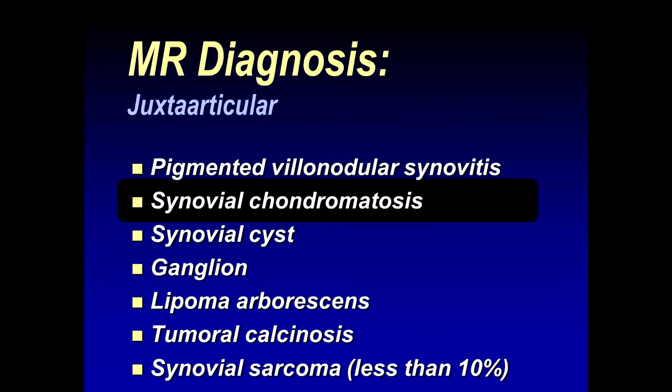And finally, there are a few associated findings such as edema that we can see very nicely, or inflammatory change around this particular lesion. You can see it in this poorly defined abnormal signal surrounding it, extending into the soft tissues with this more mineralized area centrally within it corresponding to the mineralization, and this ossification more mature peripherally seen on radiograph, highly characteristic of intermediate phase myositis ossificans.